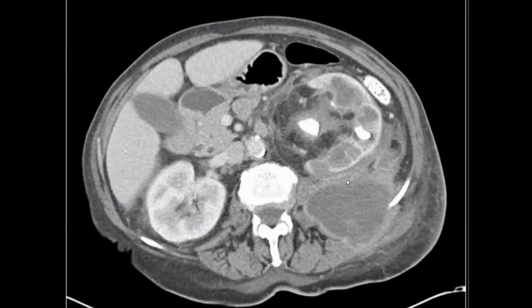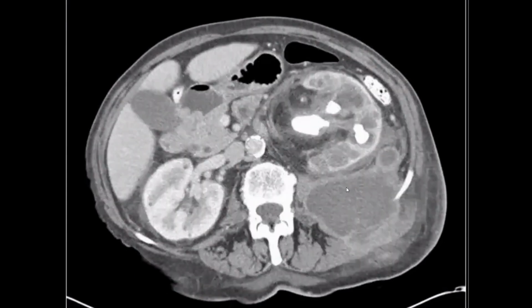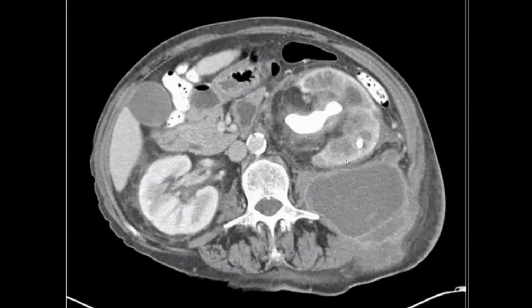So I can put the fracture. My principal diagnosis in this case would be Xanthogranulomatous pyelonephritis. Yes, you are right. Very nice. Okay, Xanthogranulomatous pyelonephritis, one of the common diagnoses here in this case.